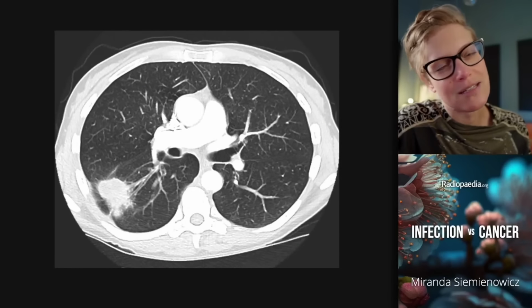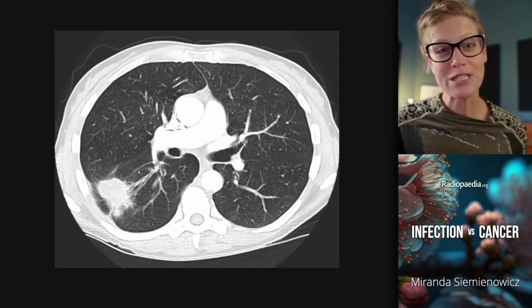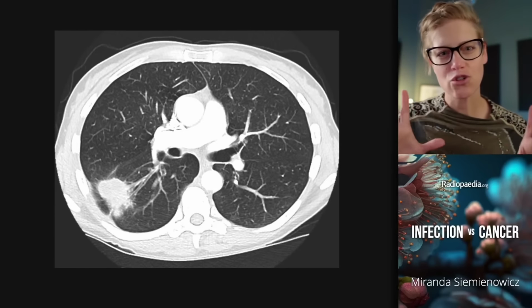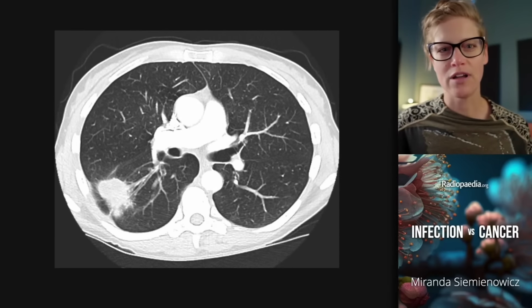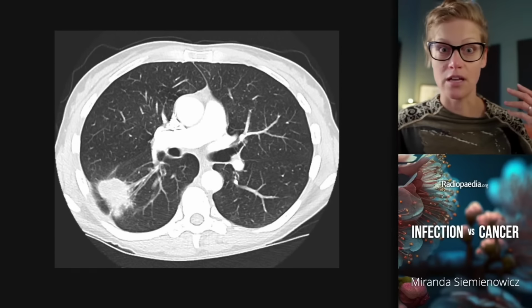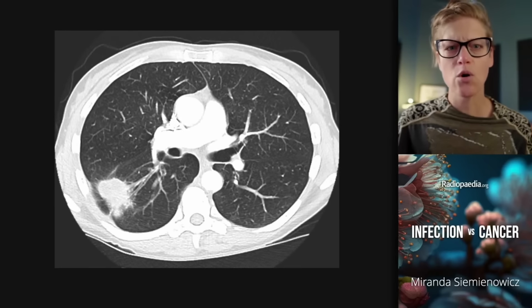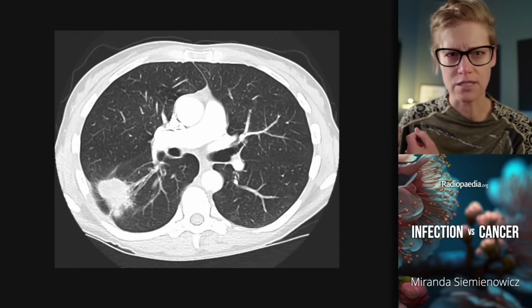People tell me that chest imaging is non-specific. That is not true. And as you will see in these cases today, there are a number of morphological features pertaining to focal lung opacities that, when interpreted as a constellation, allow you to arrive at a working diagnosis of infectious or inflammatory versus neoplastic causes. And that's the difference between empirical treatment with antibiotics and then follow-up CT in 6 weeks, or progressing to percutaneous biopsy or even theatre and all of the associated risks.